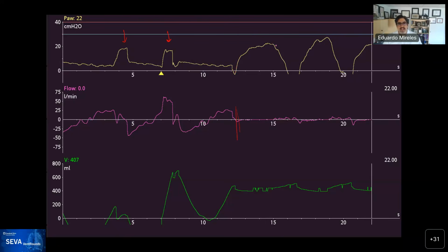So now that you know this, look at the waveform over here, and it kind of makes sense that when the patient took a breath in, it had very small inspiratory efforts, and then a lot of expiratory time on this patient. Rob, does that make sense? Yeah, it's sort of like an inverse of a normal breathing pattern. Yeah. So now the question is, well, the patient is triggering, but it's late triggering. Why is this patient late triggering?